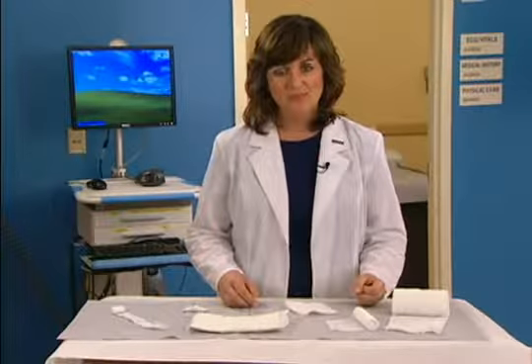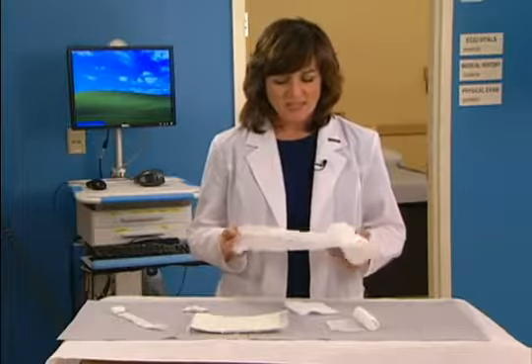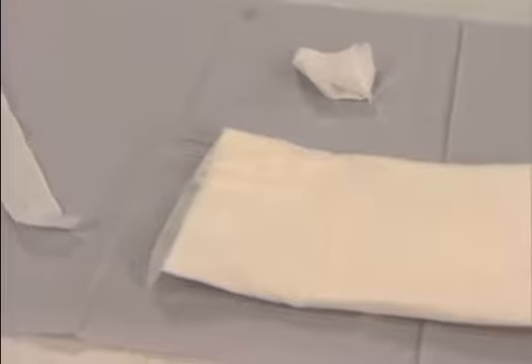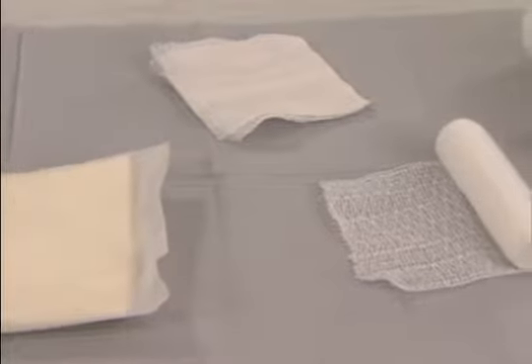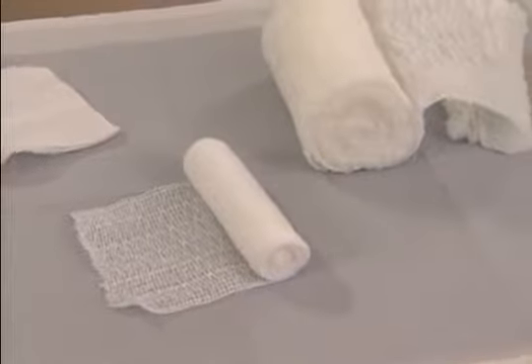This is one of a series of videos developed by WoundTx.com in which we discuss and demonstrate different types of wound dressings. Gauze has been used as a wound dressing for centuries and continues to be the most readily available wound dressing in use today. A wide variety of gauze dressings are available, with choices to be made between sterile and non-sterile, gauzes with and without an adhesive border, and woven and non-woven gauze dressings.